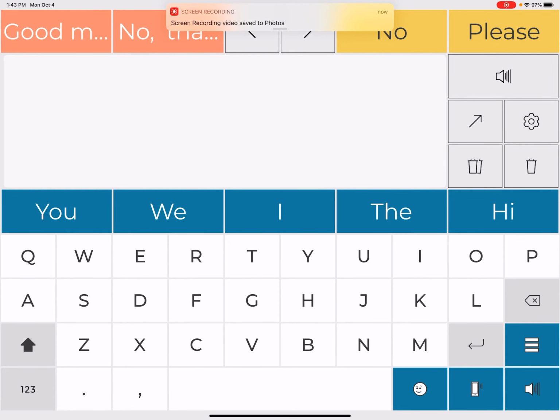Hi everyone, in this video I will be showing you the basics of the Predictable AAC program. To begin, this is your home page. After you set up Predictable, it will take you to this home page.